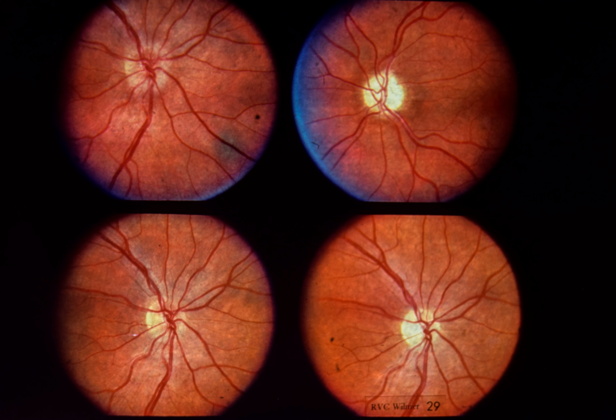This technique may prove to be of value in distinguishing optic neuritis from anterior ischemic optic neuropathy, since both may present with sudden loss of acuity, visual field defects, and optic disc edema. The patient with optic neuritis is more likely to have a central scotoma, as in this case, whereas the patient with anterior ischemic optic neuropathy is more likely to have an altitudinal or arcuate visual field defect.